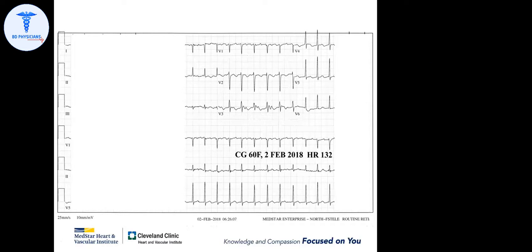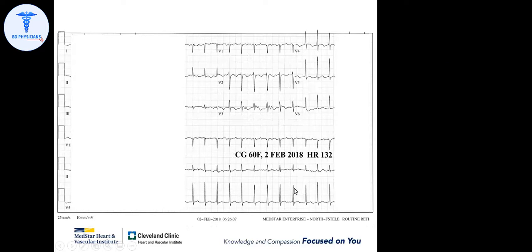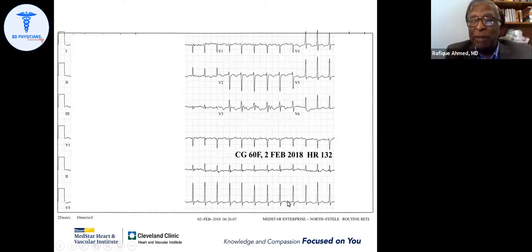Sir, looks like a regular. Yes. So looks regular. But this is the part that when atrial fibrillation becomes very fast, it may look regular. But look carefully. This interval, you can see my pointer, right? Yes, sir. It's actually shorter than this one. Yes, this is different. But if you suddenly look at it, it may look regular.